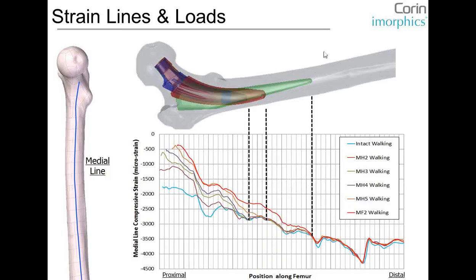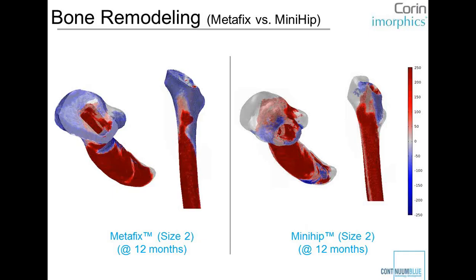You are going to get some bone loss, but this shows how much better the mini-hip, the smaller size implant, is. The great thing is you can do all these plots inside COMSOL, finding out where you get deposition over time, and you get time-dependent responses.